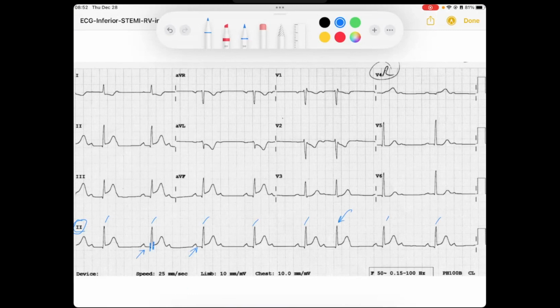And if I look here at lead 1, I see some flatter P waves. They're difficult to see, but I can see that this correlates nicely with this P wave in lead 2. My P waves appear to be upright in AVF, upright in lead 1. So this is a sinus P wave, which is important to delineate.